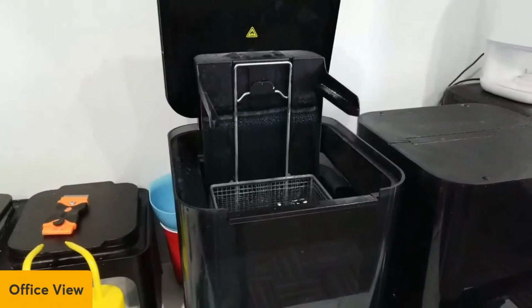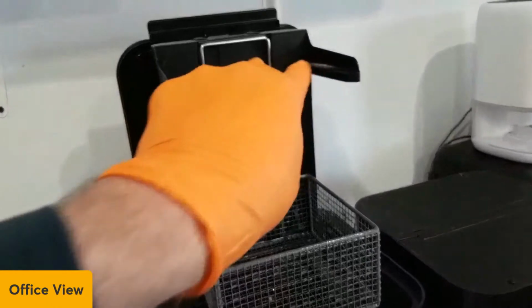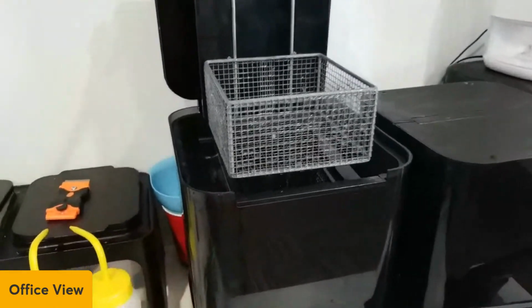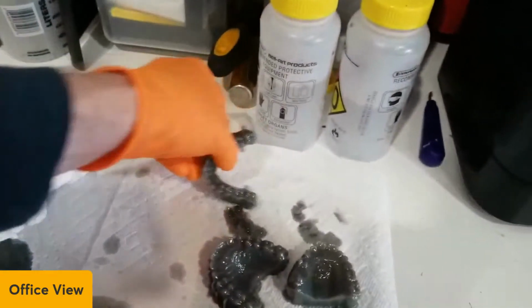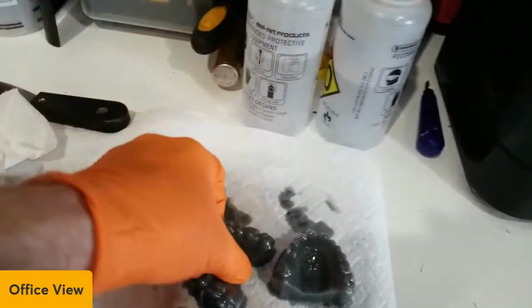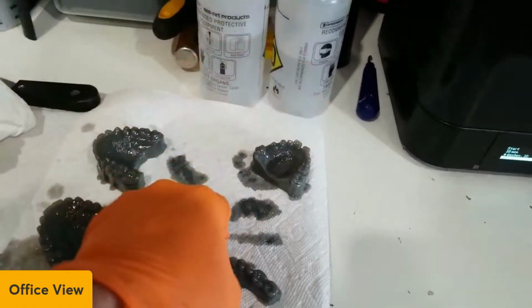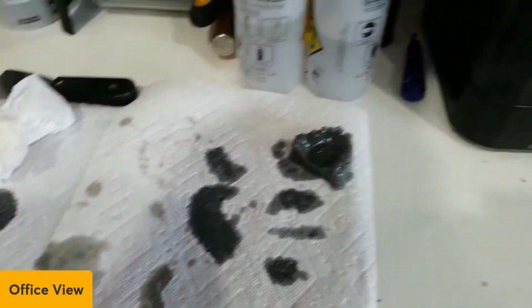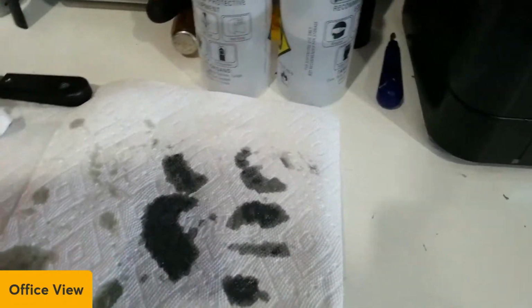And a basket comes out. And you can actually hook that build plate up here upside down. But you got to keep your alcohol topped off up here. So I'm actually going to take these models. As you can see, they've left resin puddles on the paper. Ooh, that one did a lot. Now, as you see, this one I did not drain it. I only have 2 of those drain things. So you can see how much of this is left over when you don't get to use that little tilt mechanism.